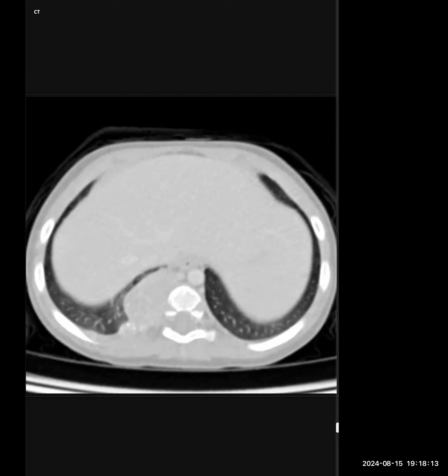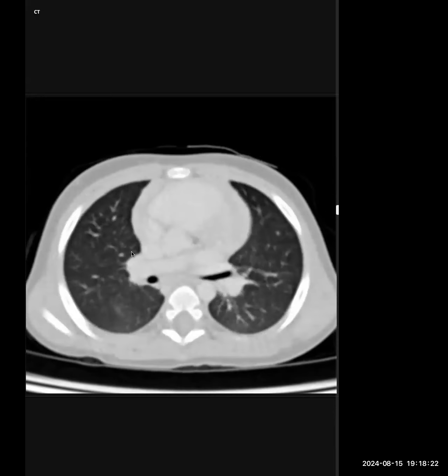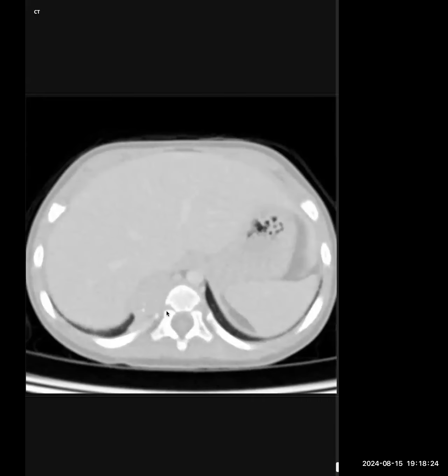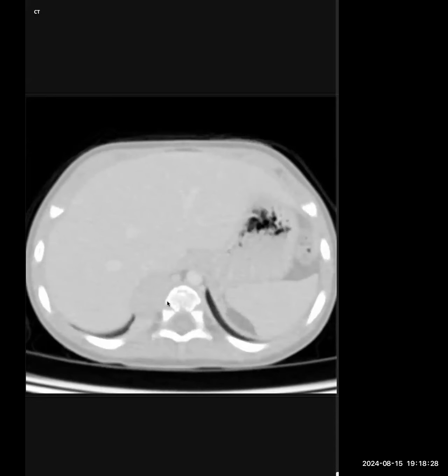So I should just mention there's a mass and then ask for a mediastinal window? Yeah, exactly. Whatever you need to talk about on this window, like you could say that I'm looking at the rest of the lungs, there's nothing much else going on. I would like to look at the mediastinal window specifically to evaluate blah blah blah. What you did, which you did.